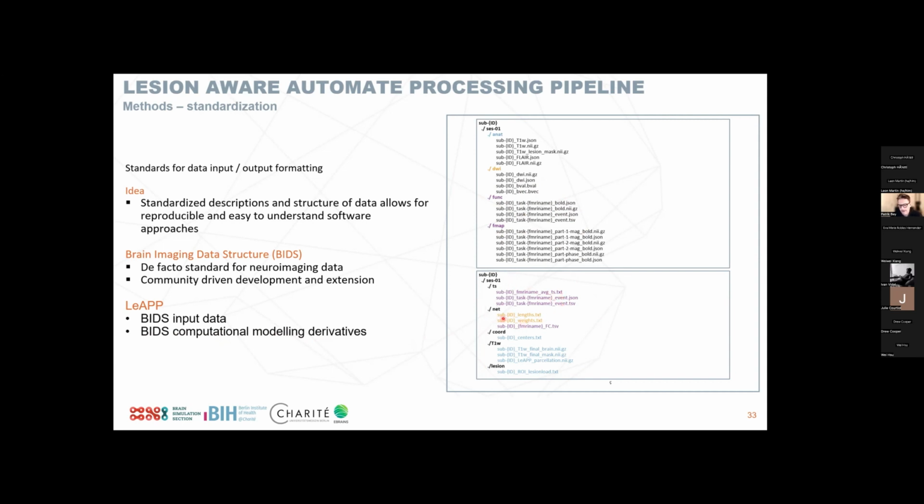So what we have here is a folder for the time series data, where we have the processed average time series for all our regions, which we want to use to fit our simulations against. We have the network folder that contains the structural length and weight matrix, and also our functional connectivity. We have a coordinates folder that contains the 3D coordinates of the centers for each of our regions. And in our case, we also added a T1 folder with the final T1 image, and also the individual parcellation that we created, and a lesion folder, which contains information about the lesion load for each specific region of interest.